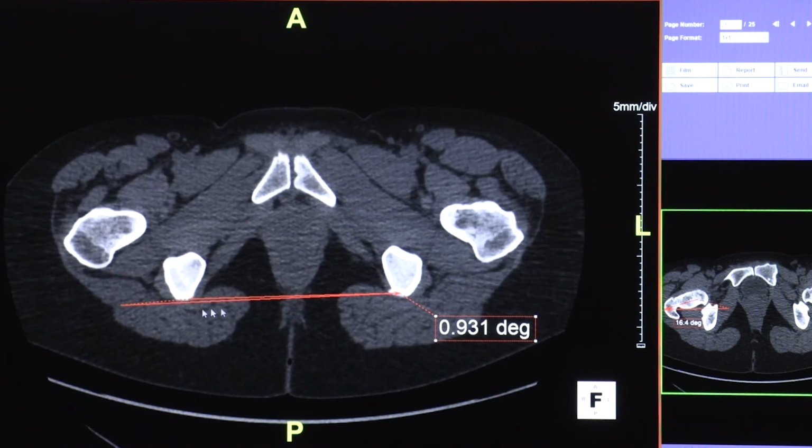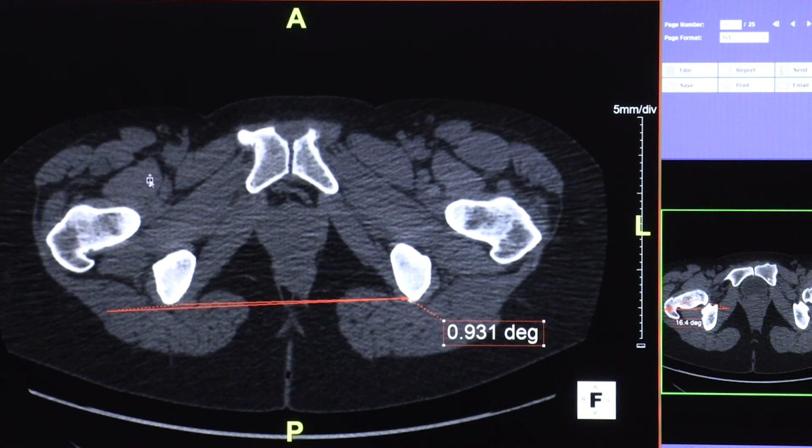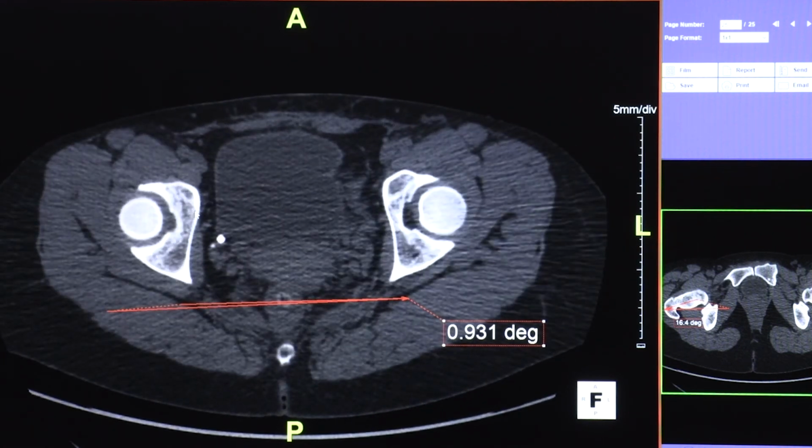So now we're going to use this pelvic tilt angle to correct the acetabular version. So we can go back to our acetabular version. So say at this point, which was close to our 1 o'clock, if the anterior to posterior acetabular connection with the vertical, which is our acetabular version at 1 o'clock, seems 9.5 degrees anteverted, and you can see the pelvis is also tilted to the right.